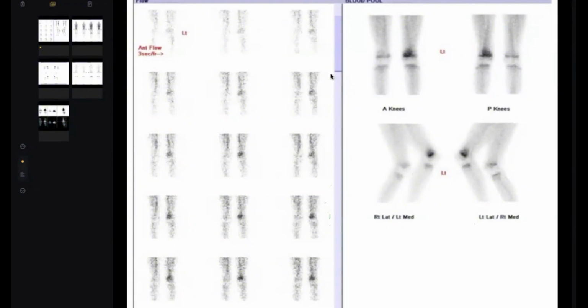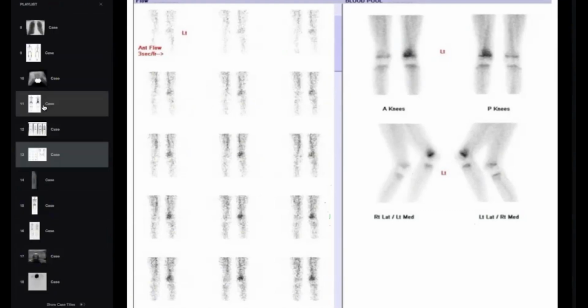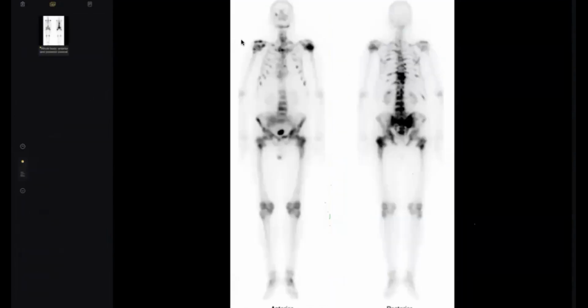She is asking about the case before this one. It was a prostatic metastasis. Why is there no super scan? I think you can consider the amount of metastasis. Maybe I'm just guessing, maybe there are no extensive metastases to the limit that prevents the kidney from its uptake. Maybe.